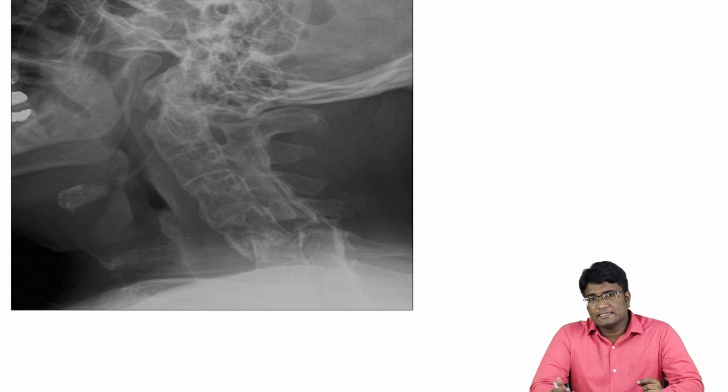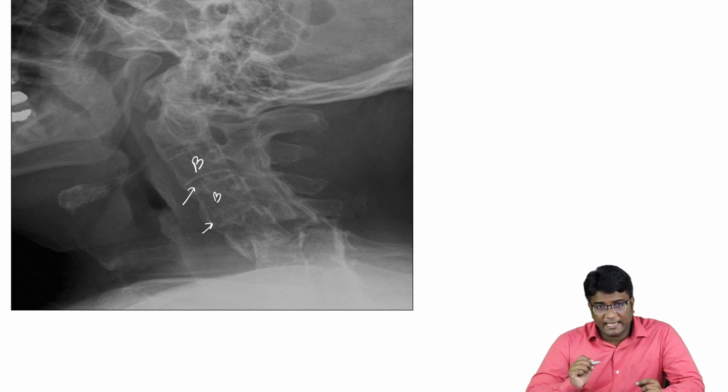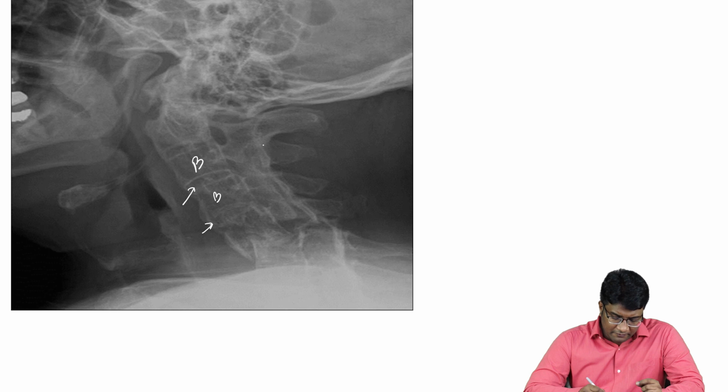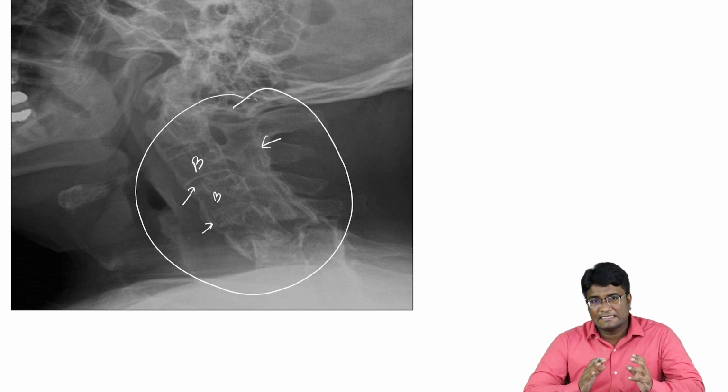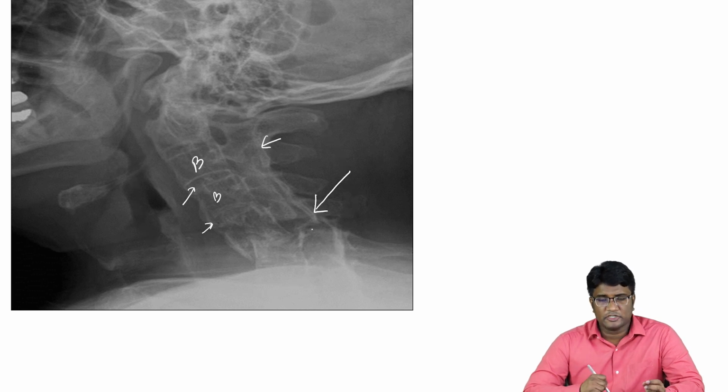And look at this another example of a patient with ankylosing spondylitis. Look at the cervical spine. I hope you can see these are the vertebral bodies. You can see the decreased height of the intervertebral disc spaces, the calcification of the periphery of the intervertebral disc, and also try to look at the apophyseal joints. Try to look at the overall mineralization of the spine. It is decreased. And you can also see some spinal fractures developing here in this patient.